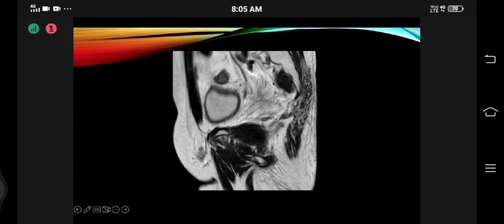So it's pretty easy. If you routinely see the MRI, normally there is an inhibition towards MRI because most residents feel that MRI is slightly difficult to read. But if you keep on looking at the cases, it's pretty easy. So this is the piriformis muscle.